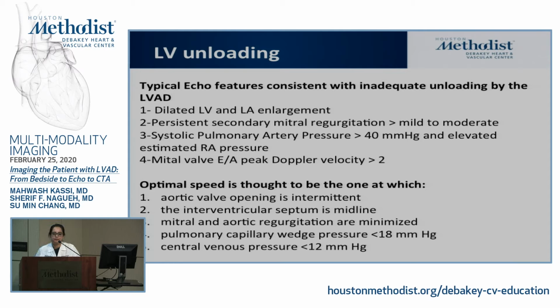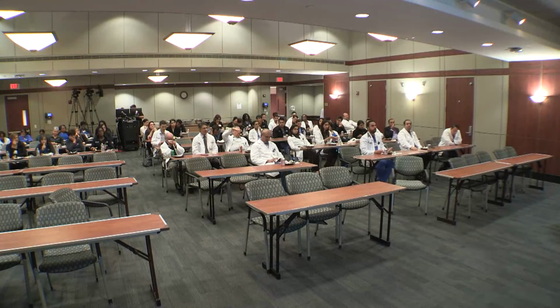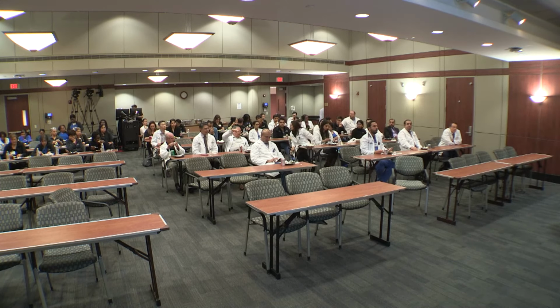So septum flattening, we see. Normally that means pulmonary hypertension, but in this situation, it could also mean excessive flow. Right. So I guess you want to hear about it. You want us to tell you the septum flattening? I do want to hear about it.